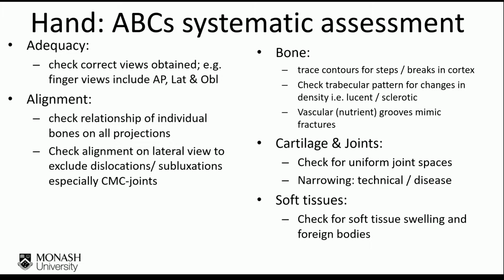Referring to the alignment, it's important that you check the relationship of each bone on all of the projections, and then also check the alignment, especially on the lateral view, so that you can exclude dislocations or subluxations, and especially around the CMC joints.